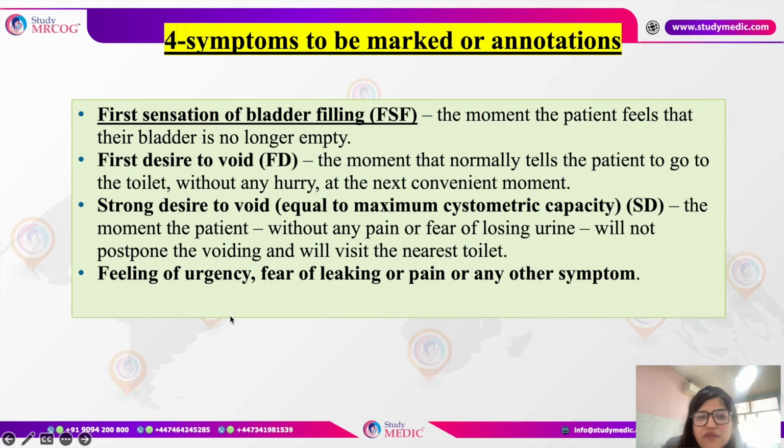And the last is the feeling of urgency, or fear of leaking, or pain or any other symptoms. So these are the four things that have to be annotated on the graph.